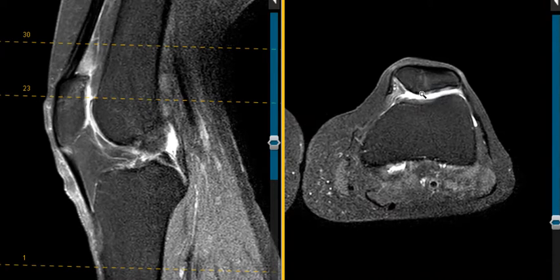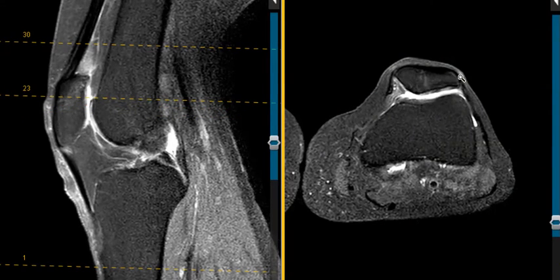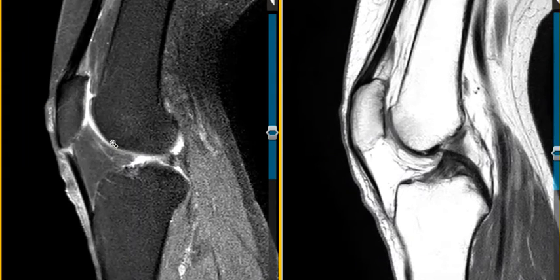And the cartilage, again, should be a thick gray band. Instead, we see a little bit of cartilage over here, and then very thin here, and then absent cartilage here. So again, chondromalacia patella with a little bit of marrow edema, but there's really no spurring of the patella, and there's no patellar subluxation. So we're going to keep on looking at this and find a couple more things.